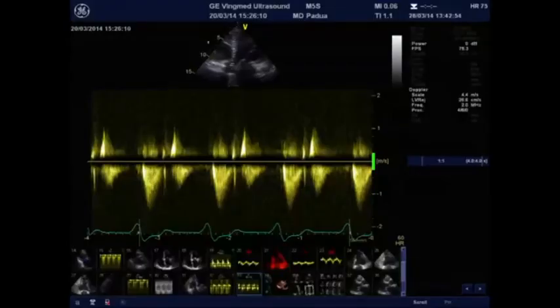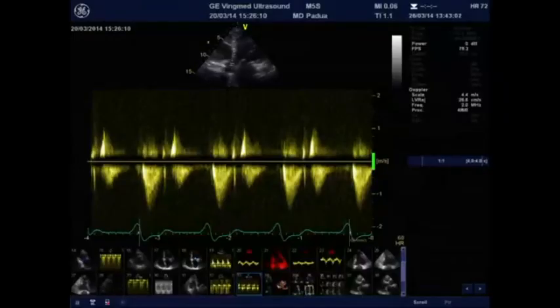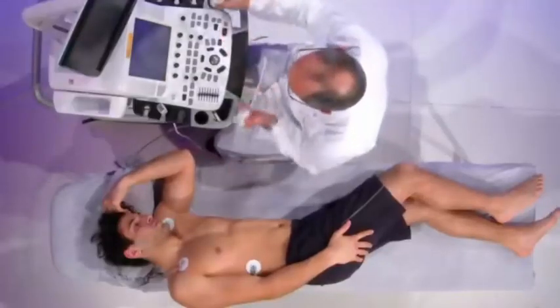If there is no trauma on the tricuspid valve due to biopsies or other issues related to the surgery, one of the causes may be the interference of the pacemaker catheter with the tricuspid leaflets. And this is something that you can easily check with your 3D scanner.